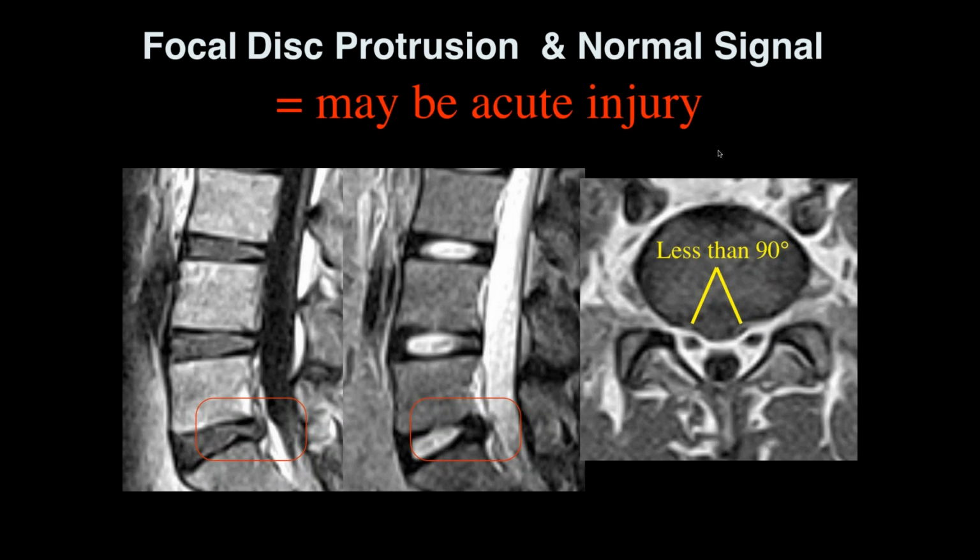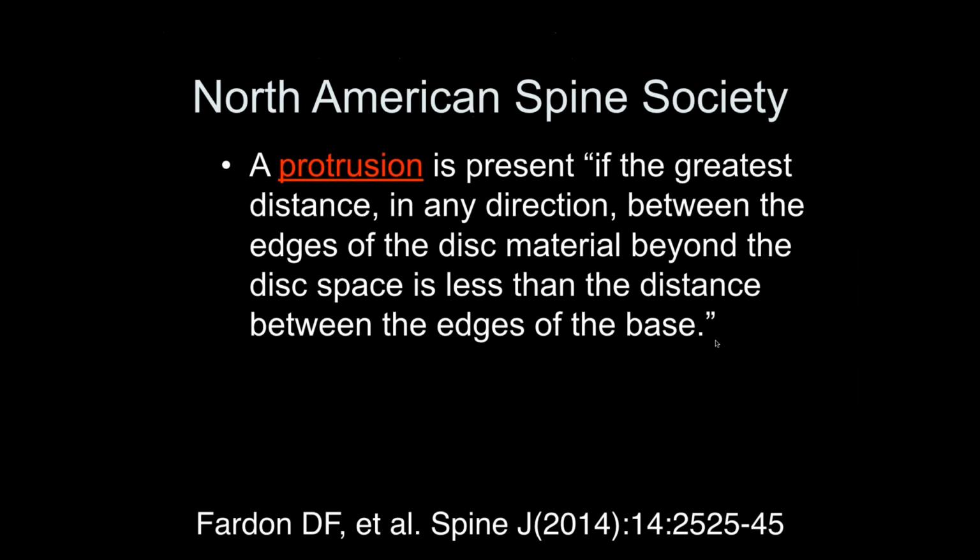Now, acute is a difficult thing to say. I tend not to put that in reports because, in general, something like an automobile accident, biomechanical studies have shown that it's highly unlikely that you'll get the kind of forces on the discs in an automobile accident that actually produces acute loading, increased pressure, and an acute herniation. Though, as you get out in practice, you'll find that a lot of people want to imply that for other reasons. But so this is a focal protrusion.